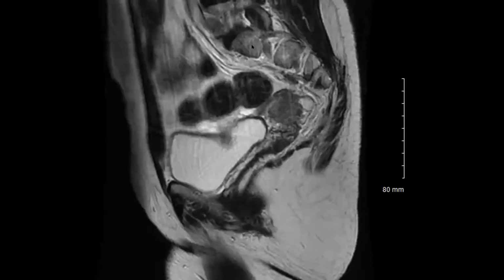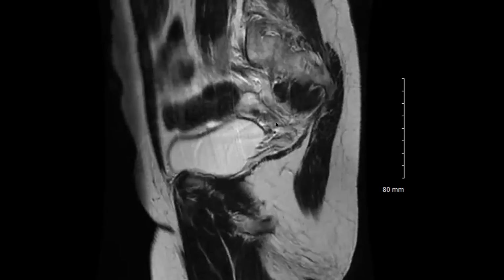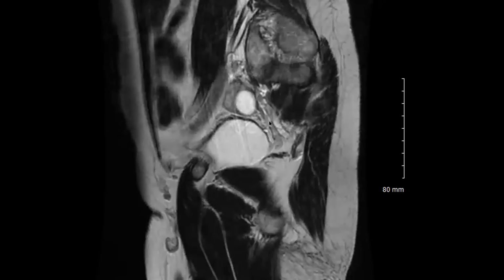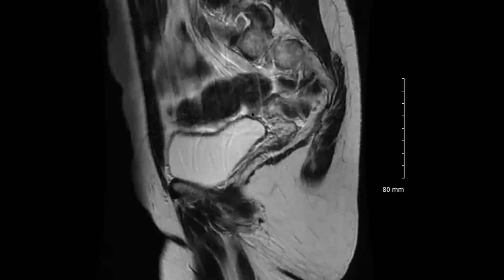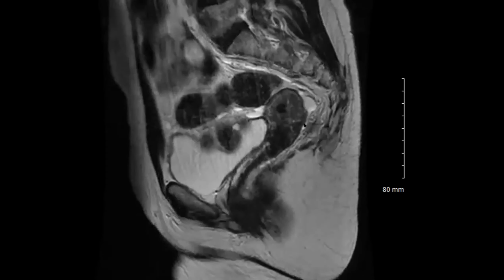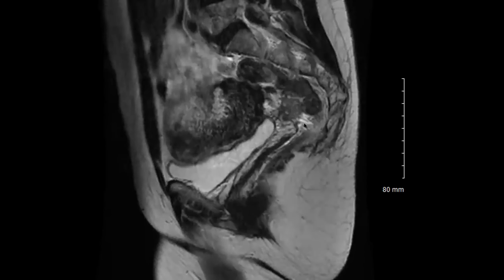Can you go back to the MR? I feel like there's more than endosalpingiosis, but I feel like I need to scroll through your case and maybe I'll do that at a different time. Yeah. All right. I can go through more sequences. I looked for DIE, if that's what you were thinking, deep infiltrating endometriosis. There was some T2 dark stuff here from the fundus of the uterus.